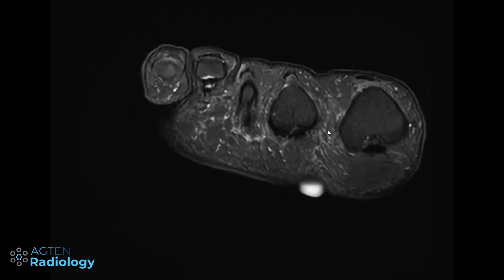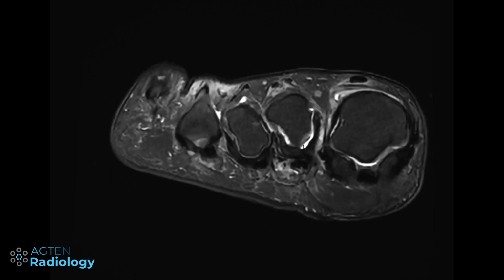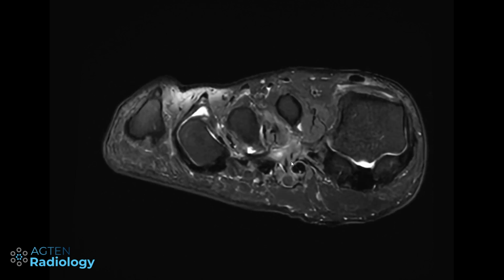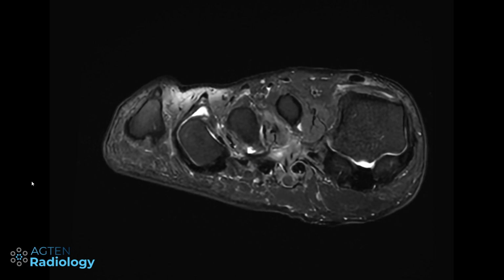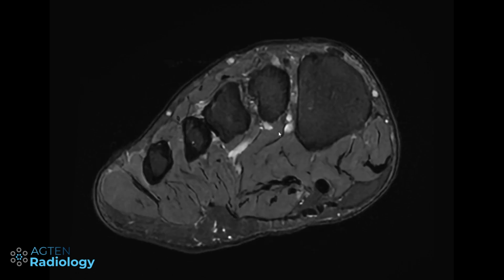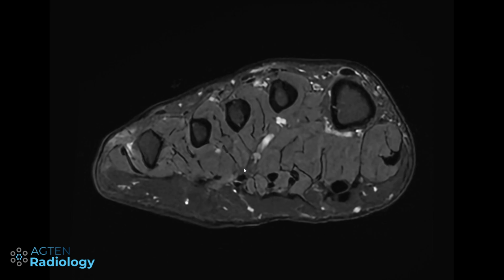Oh, there it is. Okay, so somewhere in the second ray, we see some edema here, and now we need to find out what's going on. Suspicious things here are typical plantar plate, Morton's neuroma, and plantar vein thrombosis in the more distal portions of the metatarsal veins, where we have to transition to the digital veins. Now this is one of the differentials. It's not common to have this at this location. It's more frequent in the metatarsal veins, or the plantar arch, and certainly the lateral and medial plantar veins. But let's find out here.